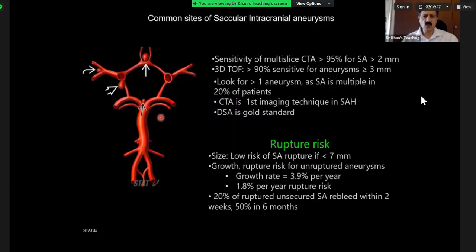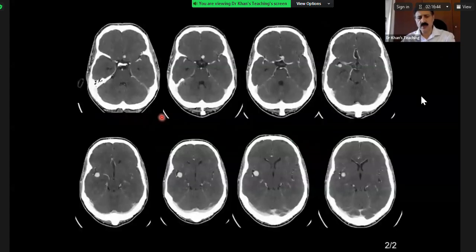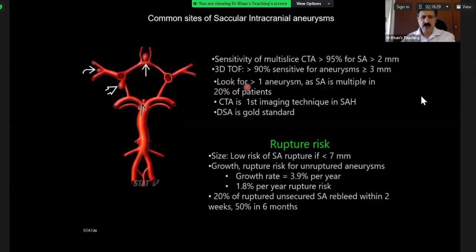And so if you go back to your case, you did very well. This was maybe the bifurcation. This one is ACOM. And you can confidently say it is ACOM because it is so common here. A few things here you have to remember indirectly, because they can ask you what you will do next, and these things are important for your clinical practice also.